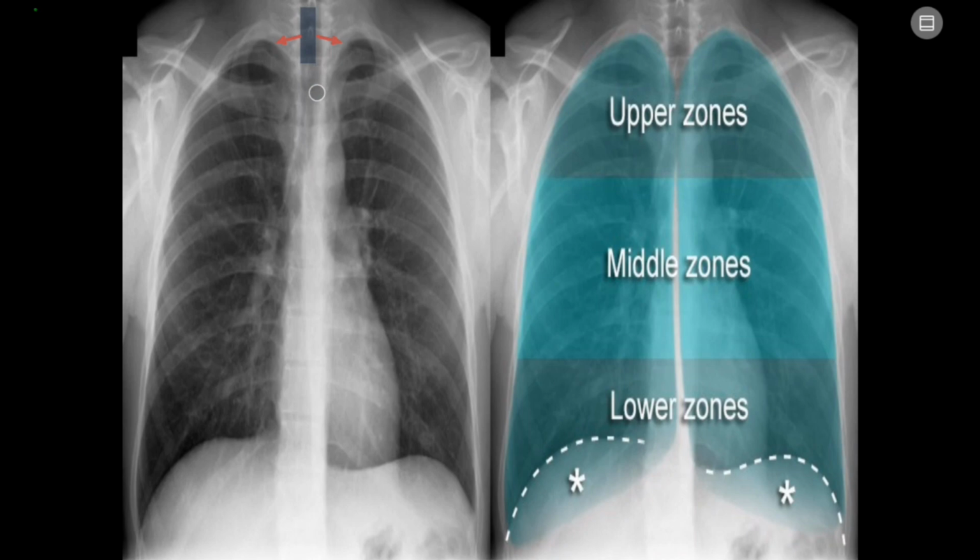So we will notice the distance between the trachea and the apex of each lung, or the distance between the spinous process and each clavicle. And we will make sure that the right lung is higher than the left one by 1 to 2 centimeters. And we will make sure that the costophrenic angles and costocardiac angles, or cardiophrenic angles, appear clearly.